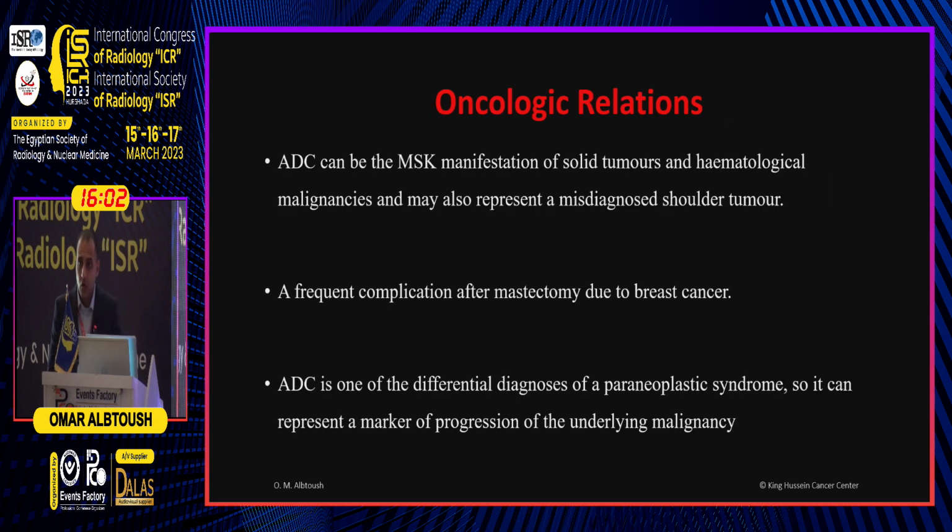Okay, what about oncology? This is important. In fact, the reason behind presenting this topic is that I'm working in a cancer center, and we always scan patients with contrast. Sometimes, to be honest, they have only pain. If someone asks me why to give contrast, I will say that it was done routinely. But we have found an important finding that contrast will increase the diagnosis of frozen shoulder.